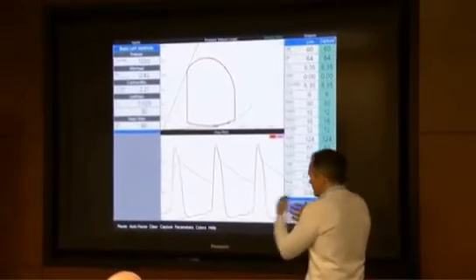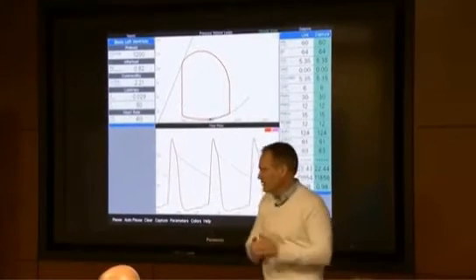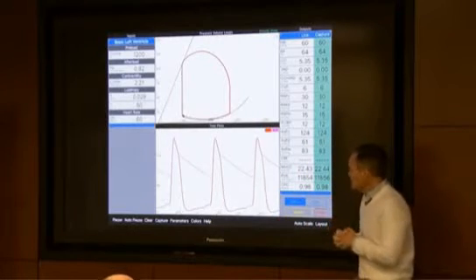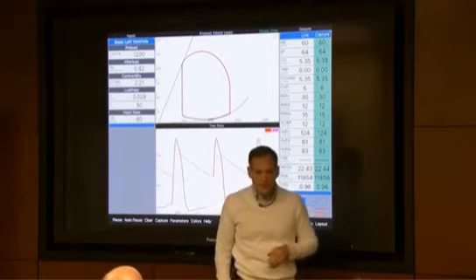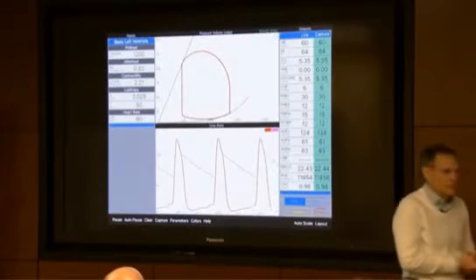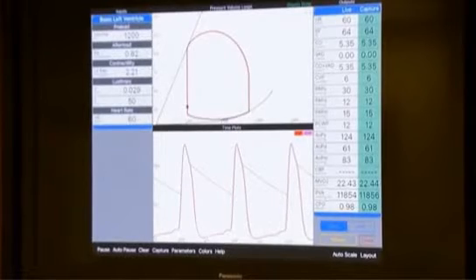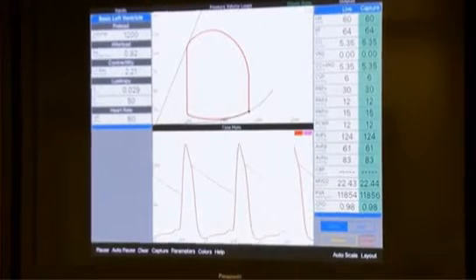It's an active simulator that's just going through heartbeat after heartbeat, doing a whole series of calculations that are based on representations of the cardiovascular system. The panels to the left, your left, are the inputs to the simulation. So we'll be able to go in there and change some of these numbers and then see what happens. The panel to the far right is the output numbers.